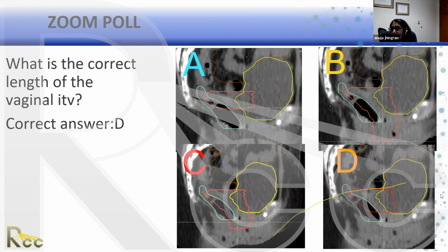And what the answer is, and this is why I know this one is right, you go to mid-symphysis, and you're still going to have a 7 millimeter PTV. So this may be even a little bit too long for the CTV because you're going to have a 7 millimeter PTV to it, right? But here, you are up to the urethra, you are treating the entire vagina. And there's no reason, unless there's risk factors, to treat the entire vagina.